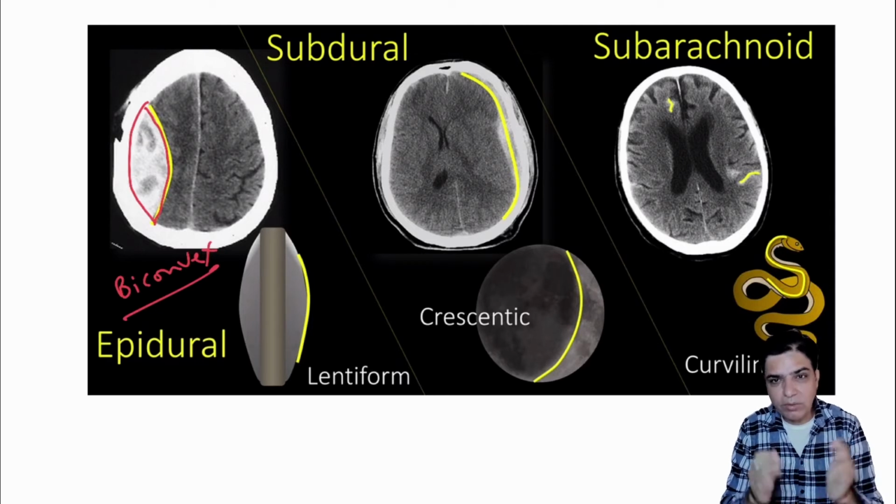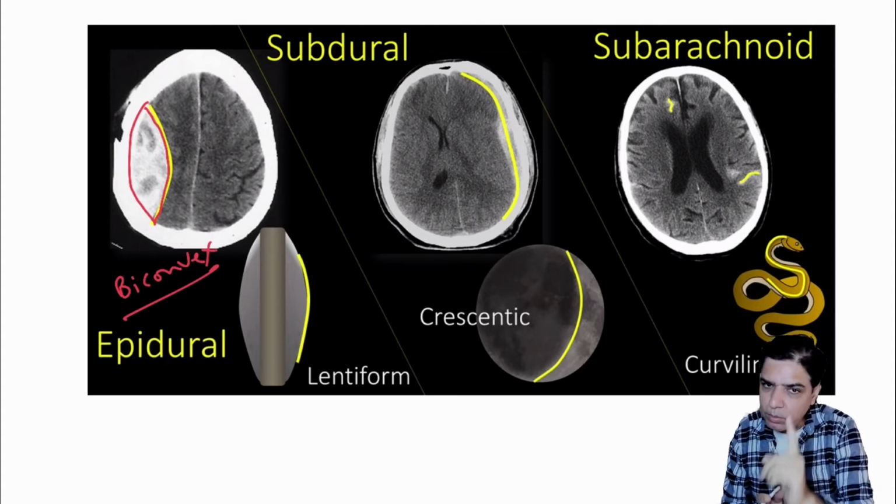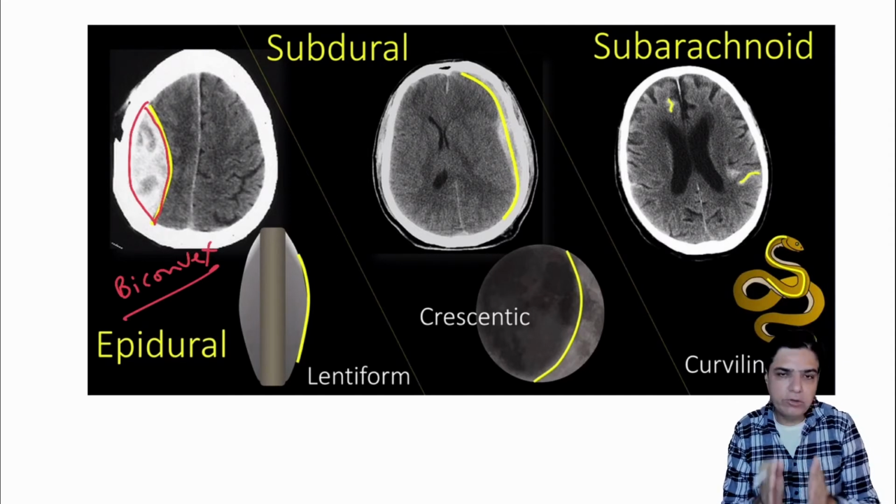So you'll just follow. Normally the sulci and gyri would be blackish because obviously they're surrounded by CSF, and CSF should appear as black. So the space between the sulci and gyri should appear black. But if there is a whitish or gray shadow coming in between, that is most probably a subarachnoid bleed. So again, you correlate it clinically.